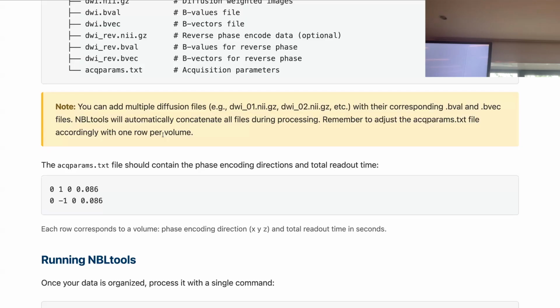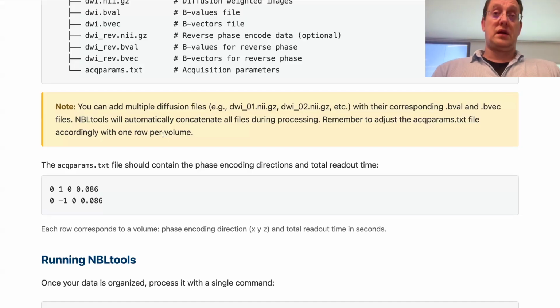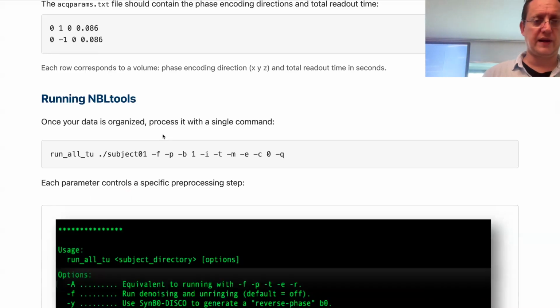Essentially, you are going to have a folder somewhere with the T1, and the software automatically creates a synthetic B0 undistorted from the T1, and then you're going to use this with topup to generate the field mapping the same way. So if you don't have the reverse phase, you can use the T1 with SynB0. Okay, there might be some bugs to fix with that, because I'm using SynB0 manually, separately, so I do the field map by myself, but in theory, this script should be able to manage everything automatically, but I haven't tested it heavily. So with time, we can test and then you can complain to me.